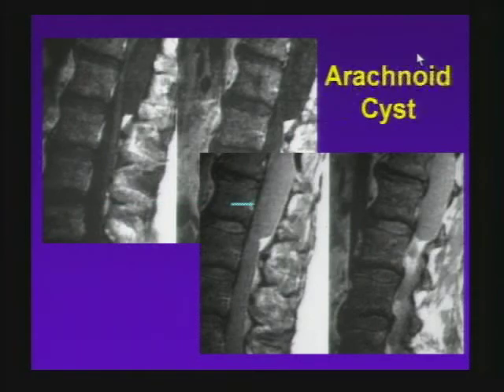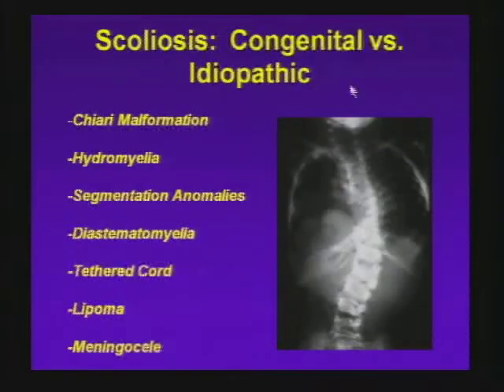So the differential of this lesion right around the conus is just what it would be in the CP angle for something that's non-enhancing extra-axial. It would be epidermoid versus arachnoid cyst. You would want to elicit, was there a spinal epidural anesthetic? Was there an LP, which might have created an epidermoid? So there you have it, just think about it as the brain.